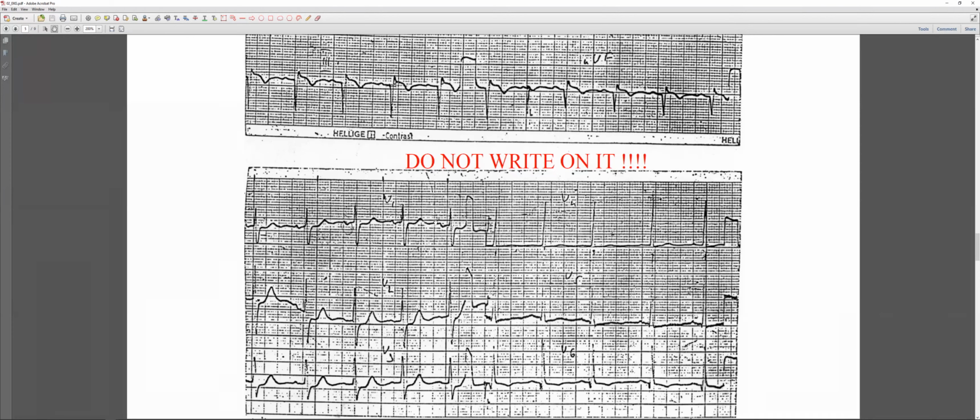Okay, so instead of the Q, we do see a tall R wave, initial R. Instead of ST elevation, we do see a ST depression. So it's also posterior, exactly. So that's an infero-posterior acute MI. Yes. And if you get closer a little bit, I help you.